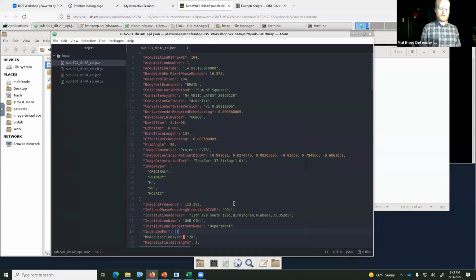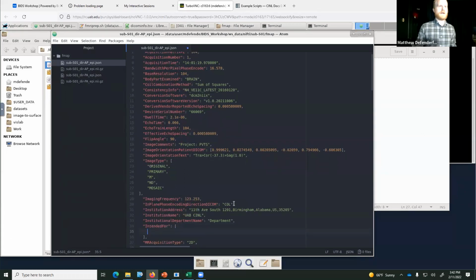And you're going to create a list of files that this field map is associated with. So which files are you applying the field map, or applying the distortion correction generated from this field map to? In our case, we're applying the correction to both of the functional scans that we had, as well as the diffusion scan, okay?